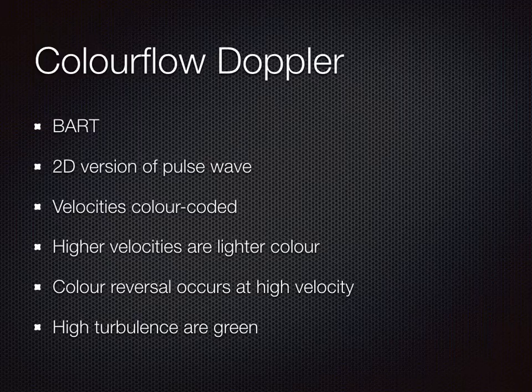Okay, so now we're going to look at colour flow Doppler. Now remember, Doppler is able to tell us about things that are moving, and with colour flow Doppler, blue away, red towards, like Bart Simpson. And basically, it's quite complicated how it happens, and how it works. But really, you have to just look at a few pictures and understand which way the blood would be going. If there's very, very high frequencies, so say there's turbulence due to a narrowed valve or something, then it often shows up as green. But on the whole, you get blue away and red towards.